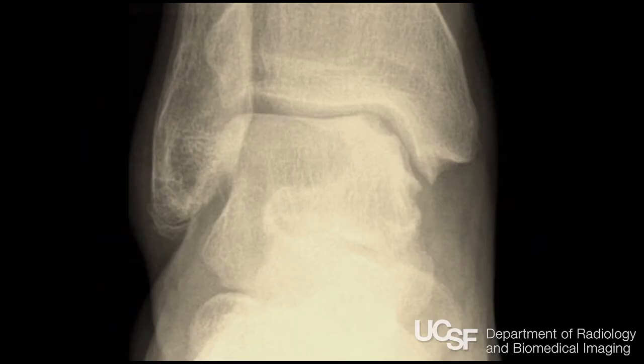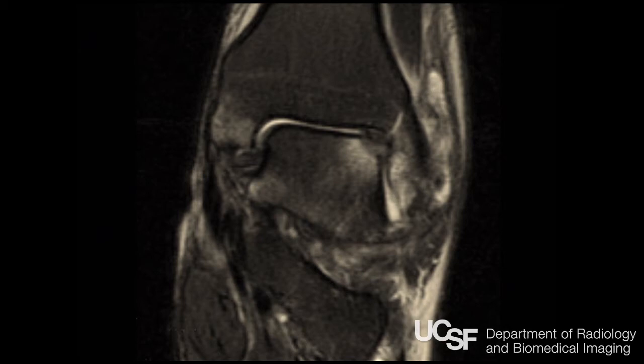Another thing that happens with ankle injuries is sometimes you shear off the talar dome. Here's a person with an old avulsion of the fibula, but you look here and you have an osteochondral defect of the talar dome. Sometimes this is from repetitive mechanical stress. Sometimes it's an acute injury that leads up to it, an ankle sprain. This is an MRI showing the edema.